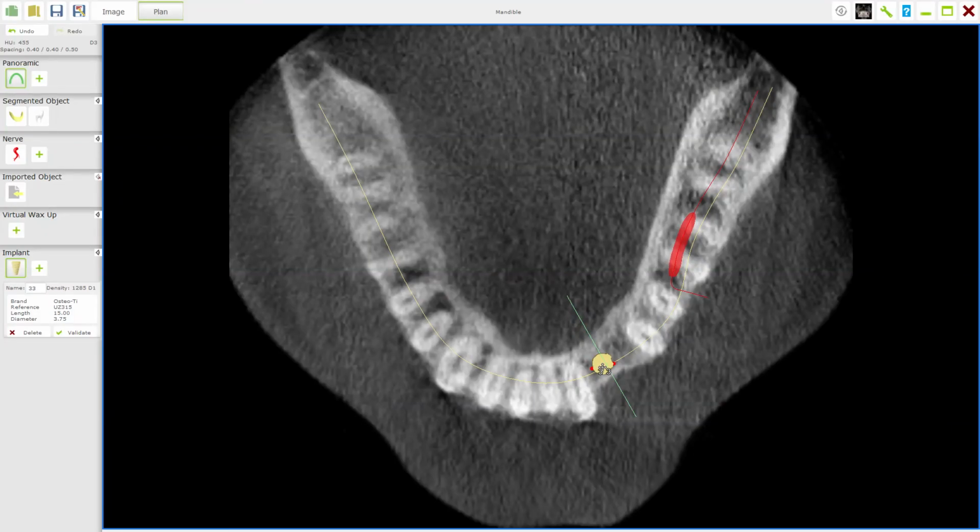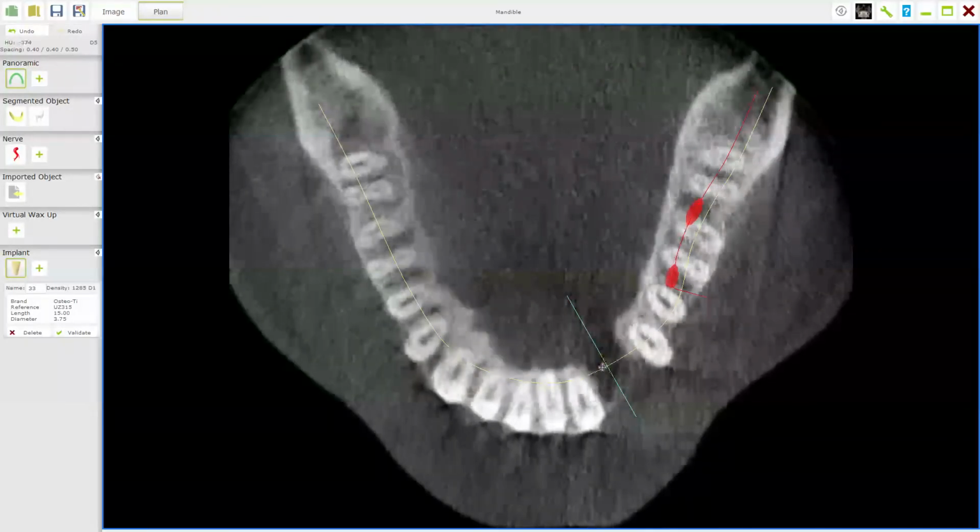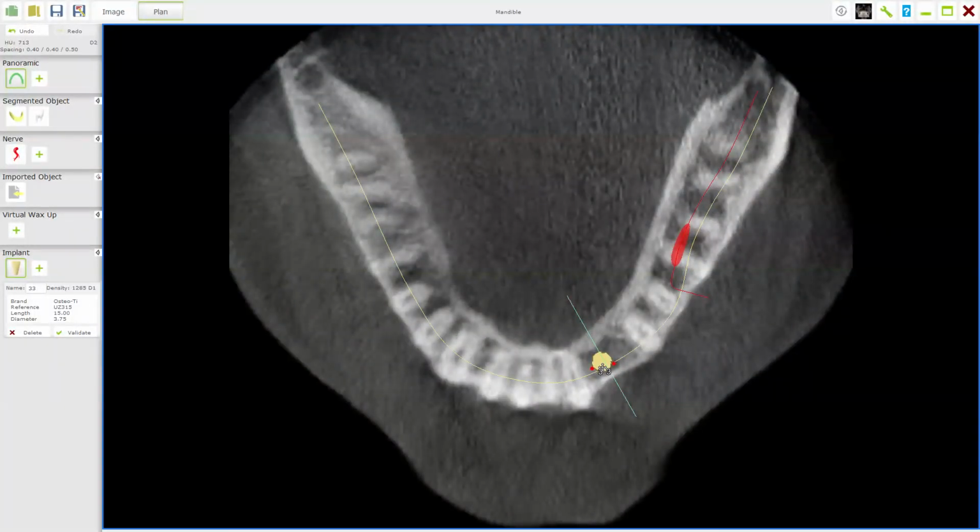You need to maintain at least a 1.5 millimeter space between your implant and your tooth all the way along. So again, if you're working in a very confined space, okay, we've got nearly 10 millimeters of space here, which is huge for a canine. But suppose we'd lost space, which is more often the case. If we had like 5 millimeters of space, obviously positioning that implant has to be optimal, because half a millimeter one way or the other mesiodistally might end up sticking it into the root of the teeth either side, or the periodontal membrane space, which again could be detrimental to the whole process.